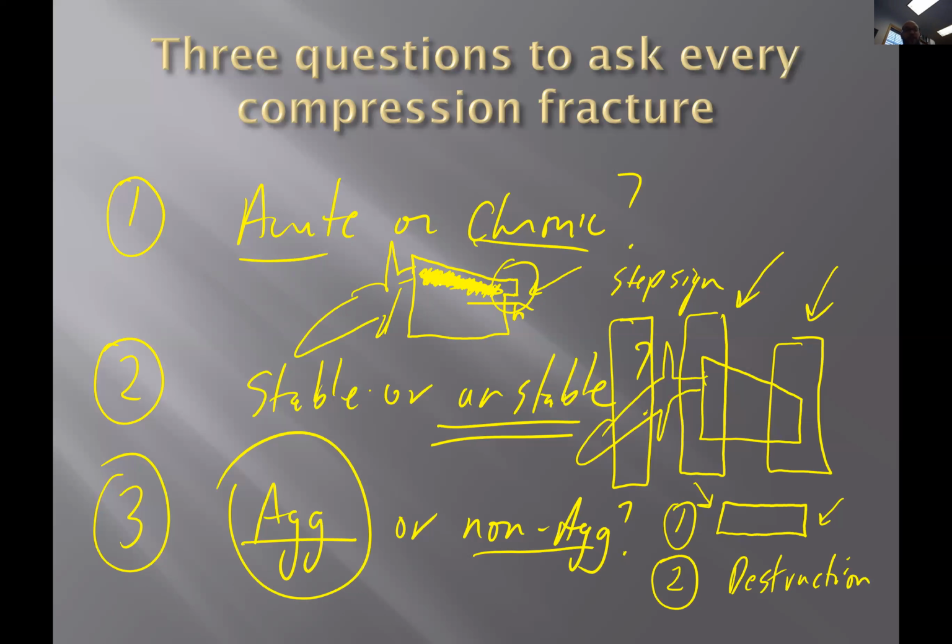It could still be acute, but it could be chronic. And so you have to clinically correlate. Does it hurt right there? Is there trauma? If it hurts right there and there's trauma, clinically you favor acute. But look, the lawyers are going to debate. The lawyers are going to argue. You would have to get an MRI if you want to be definitive from an imaging standpoint. But look, for only $45, if you can see that step sign in that zone, you've got evidence that it's acute. Does that help?